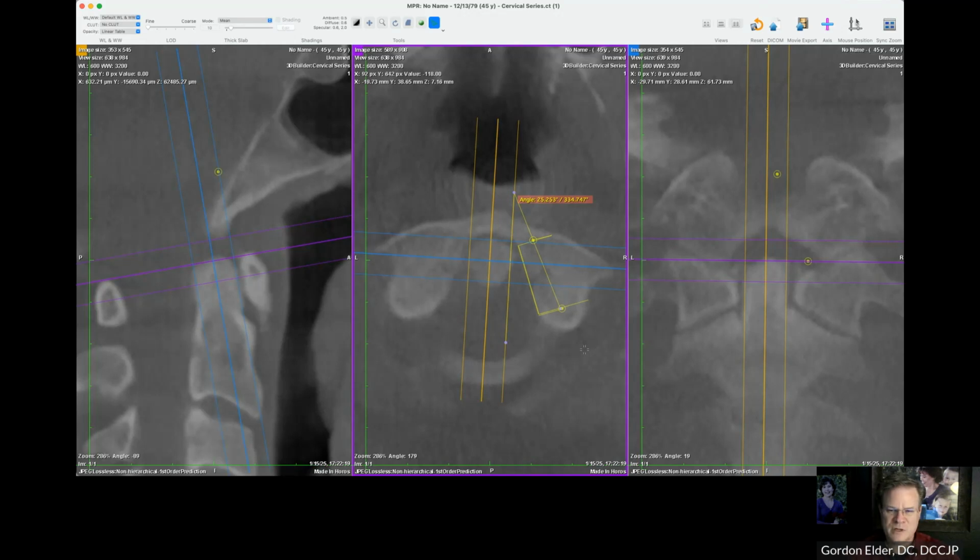Even if the person has never had an injury and does not have a subluxation by anyone's definition between C1 and C0, there are going to be some areas that do not line up because the joints are not mirror images around all the edges. It's only on the outside lateral margin parallel to this convergence angle.